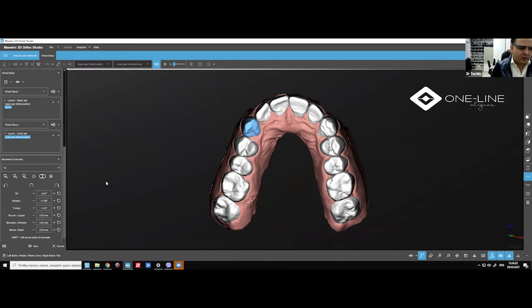I will not do all of it together right now. I'll do just, let's say, 6 weeks right now. The reason being, I want to do only 2 aligners in the beginning for the canine to go back and make space for the lateral incisor and for the canine. This is my standard protocol. So we've gone back 0.18. That'll be 0.20. Let's make it 0.30. So that's the IPR which I'll be needing between the canine and the premolar.